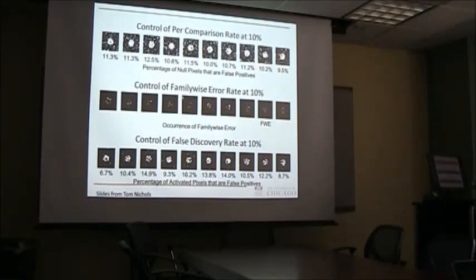But the good thing is, right, there's very few times that, like on this part outside of this red circle, we call statistically significant. If you compare that to the false discovery rate, it's just a different type of test statistic, or a different way of correcting your p-value.